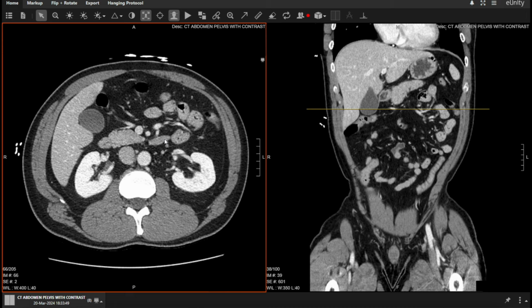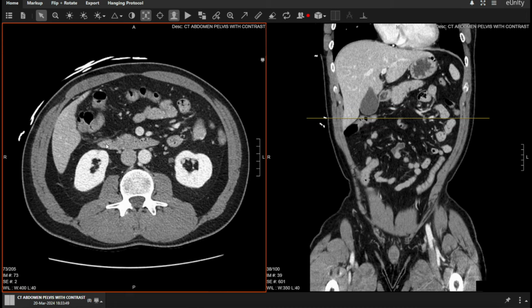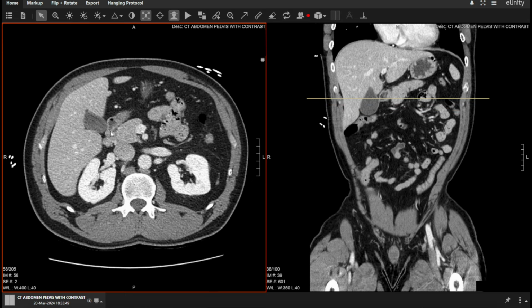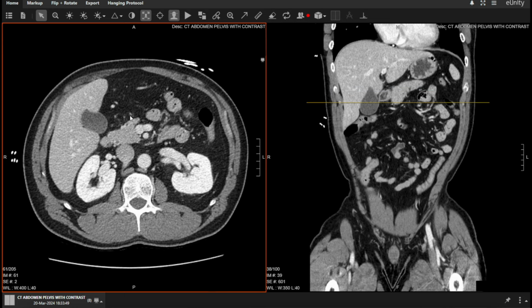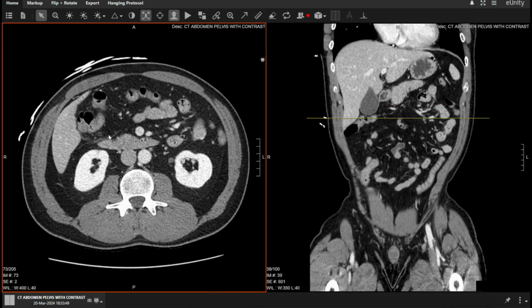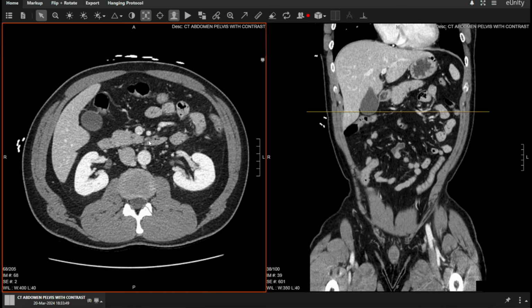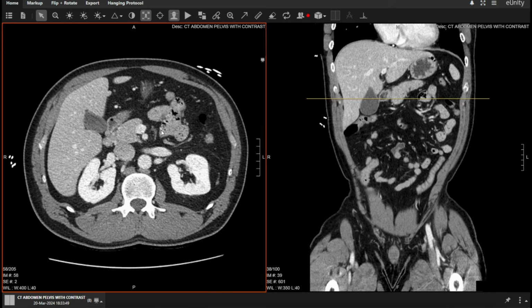We'll go in reverse now. Follow it back here, here, to here, back up into the stomach. After the duodenum crosses midline, it crosses through the transverse colon mesentery at the ligament of Treitz, where the jejunum begins. Now, in terms of tracing the small bowel, that can be really, really challenging.